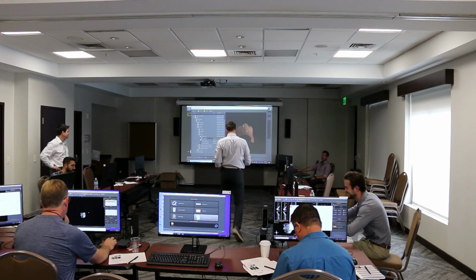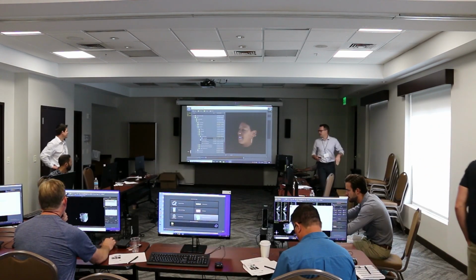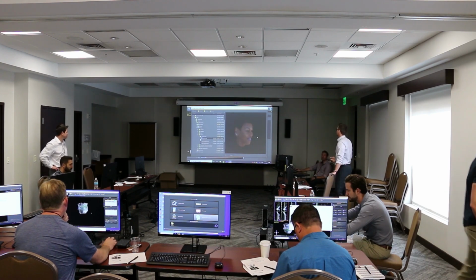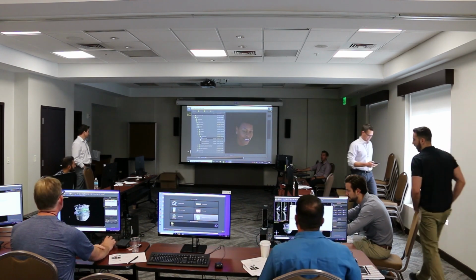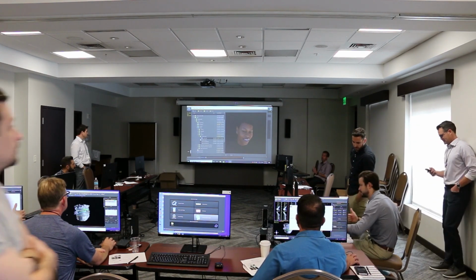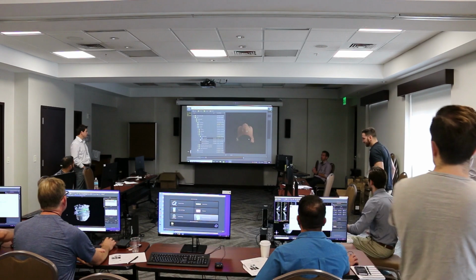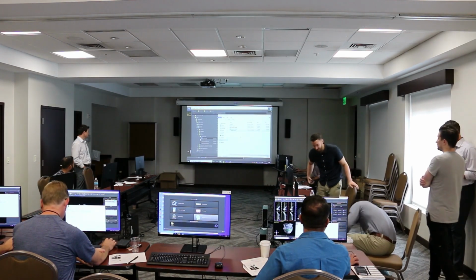Yeah, exactly. So you guys see how it's in color now in the preview window? This is how it's supposed to look. If it's black and white, that means you didn't have the complete file, like we didn't have the complete file the first time. Or it means that the file is still in a zip folder that you forgot to unzip. Are there two files or just one? Yeah, just one. So it should look like this.